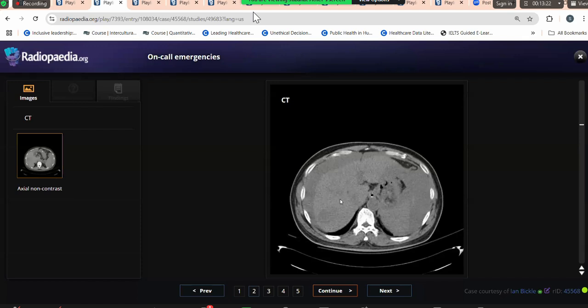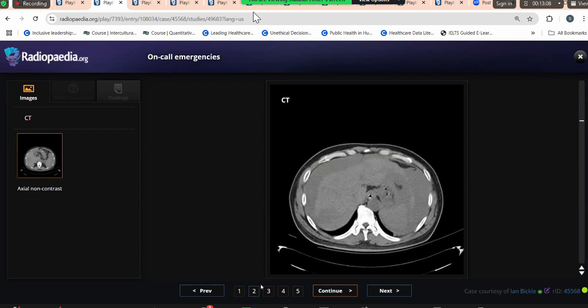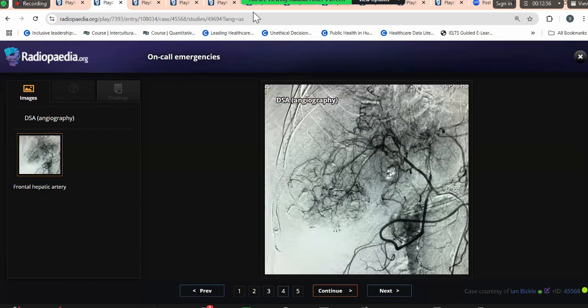That this is a plain study. My evaluation is limited, but considering the liver morphology and the multifocality, HCC would be more probable to bleed and cause hemoperitoneum. Okay. Again, this was done quite well. I'm happy with it. But always mention that this is a plain study. This is something which I did not show, but this was a DSA done by the IR team, and this was an HCC which showed that there was an active cause of the bleeding here.